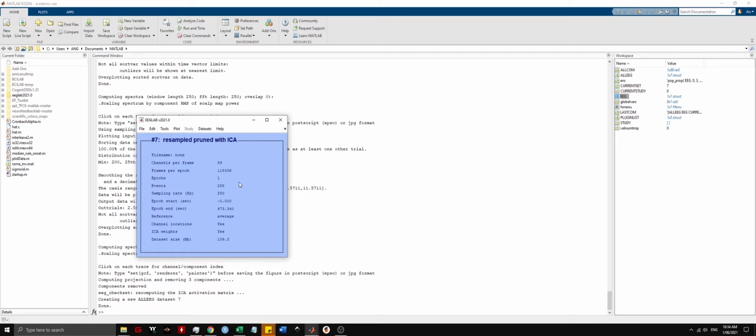And so by looking at ERPs, you can make interpretations about what the brain is doing or doing differently between conditions. And to do this, you consider the task that the participant is doing, the location of the effect in space and time, and maybe by examining the relationship between these potentials and behavioral performance metrics like reaction time and accuracy.